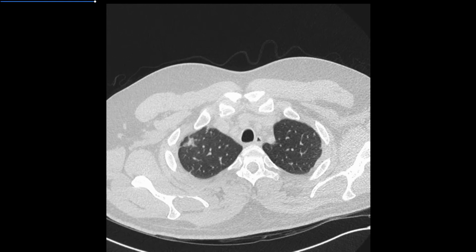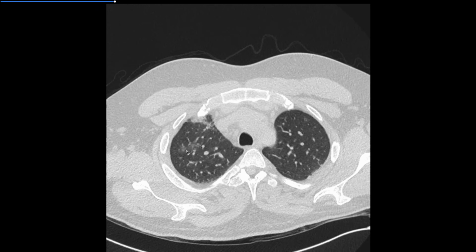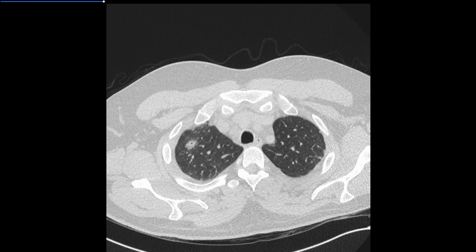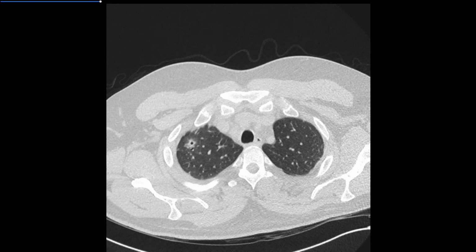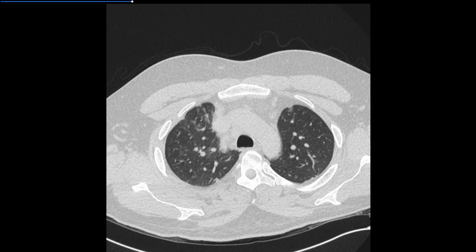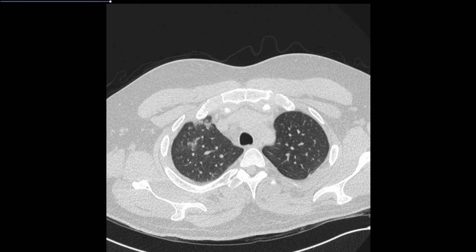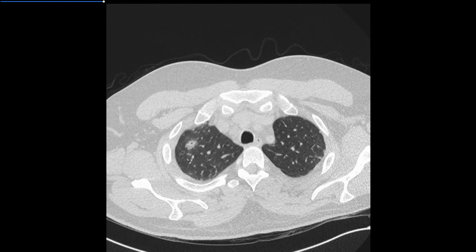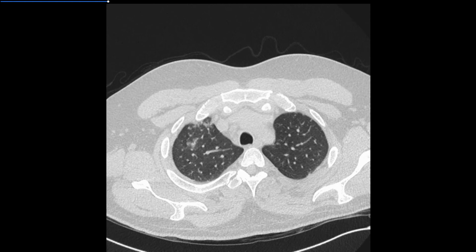So these are really typical bronch bites, so-called. They have presumably a little bit of hemorrhage around them, but otherwise they're pretty consistent with so-called bronch bites. Sometimes we see them later on when they're just cystic lesions. This one has presumably some hemorrhage around it. But in terms of what they did and the timing of it, these are so-called bronch bites, not to be confused with any other pathologic process. Have you guys seen these in the fairly acute setting when they might have a little bit of hemorrhage around them and therefore simulate things like septic emboli or cavitary infection?